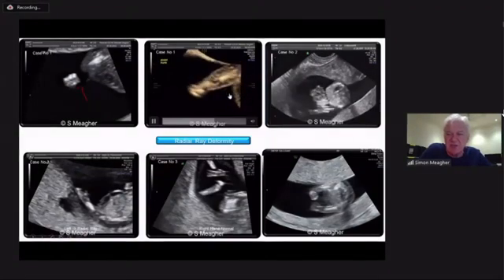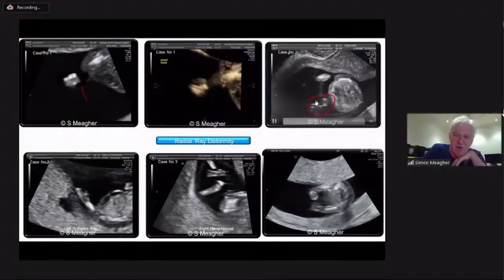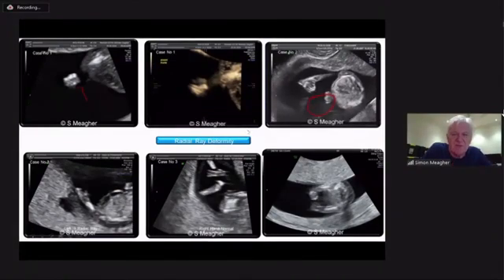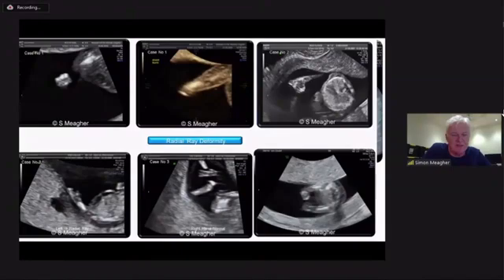In case number 2, you will also note that there's an omphalocele and that flexion deformity, absent thumbs, and a single forearm bone, which will be the ulna, which may be shortened. So for many of these, again, when you see them, look for any evidence of associated malformation. In this case, in the bottom right-hand corner, fixed flexion deformity. As you scroll down to the abdomen, it also had an anterior abdominal wall defect.